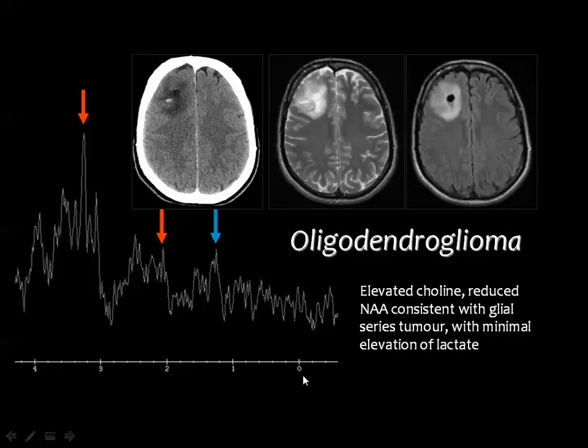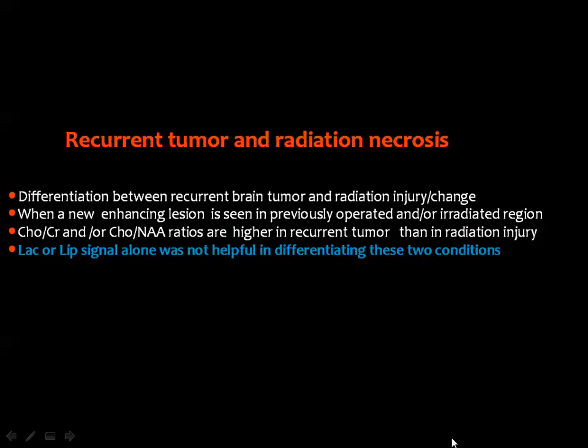And you know that diagnosis is based on the presence of a tumor with internal calcification, and calcium is usually seen by CT, and it may sometimes be indicated by MRI. In oligodendroglioma, you also get decrease in the NAA, and this is the creatine peak with elevation of the choline, similar to any of the tumors.